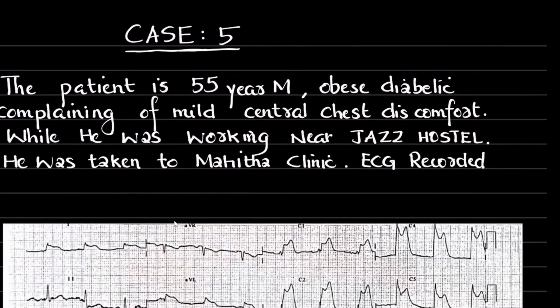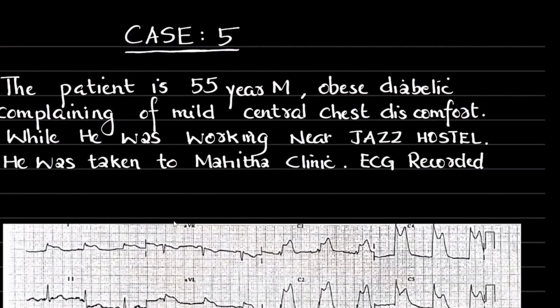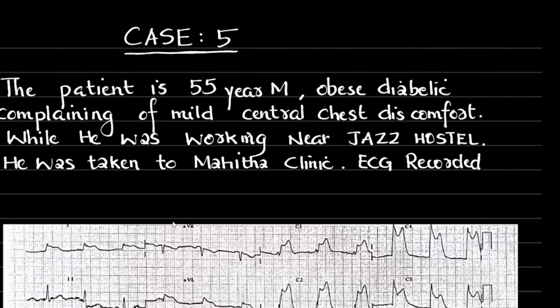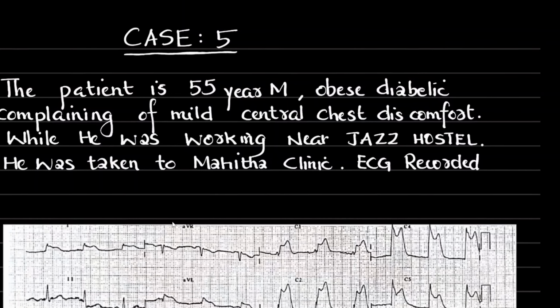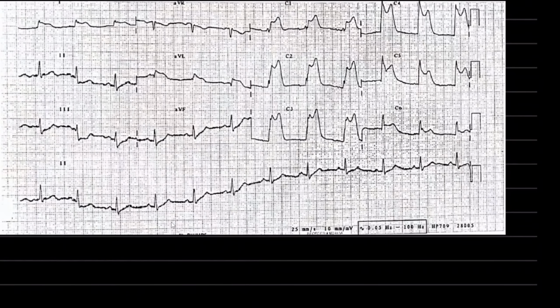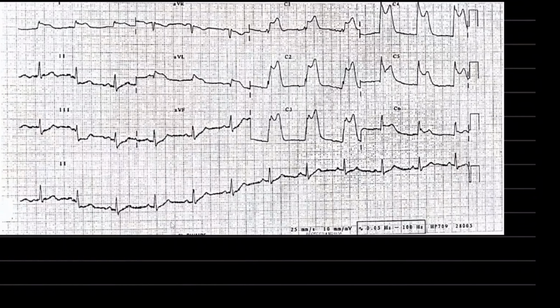Today we are discussing a case. The patient is a 55-year-old male, obese, diabetic, complaining of mild central chest pain while he was working near Jazz Hostel. He was taken to a nearby Mahita clinic and an ECG was recorded. So let's see the ECG. What is this ECG?